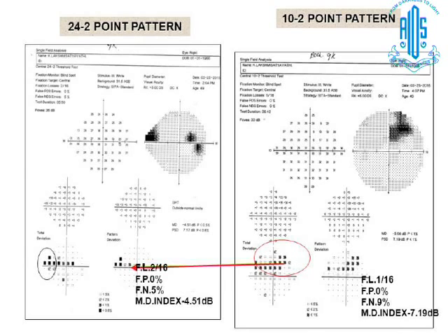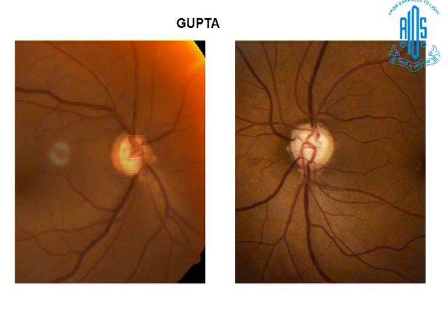This is a dangerous situation. And if the patient develops like this on the lower side also, the patient is going to have severe visual loss in no time. And still the mean deviations will be very normal. Now we are dealing with cases occurring simultaneously in both 10-2 and outside 10-2.